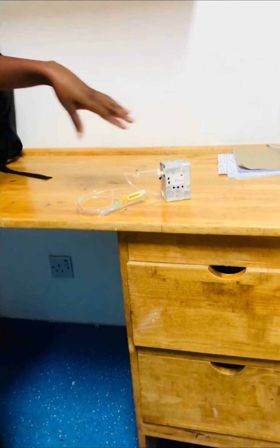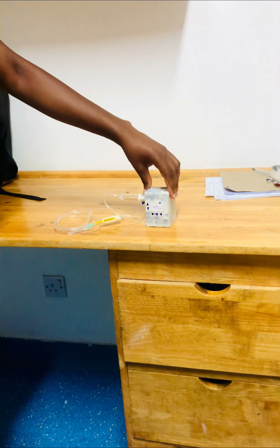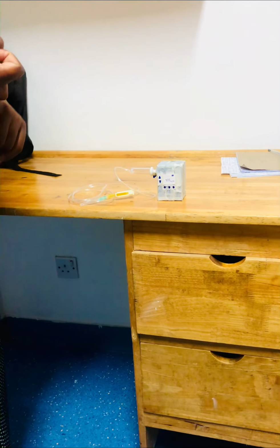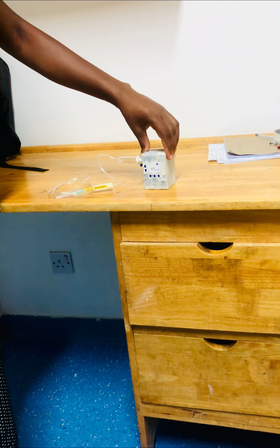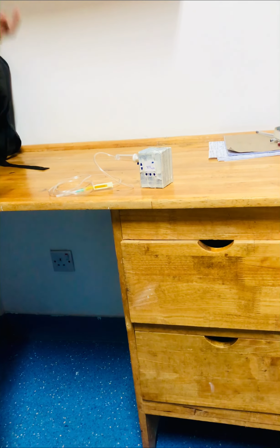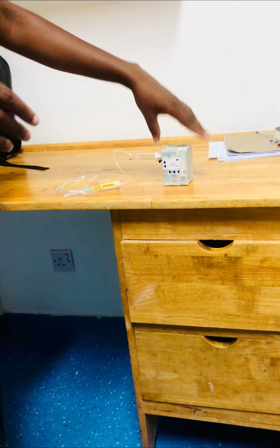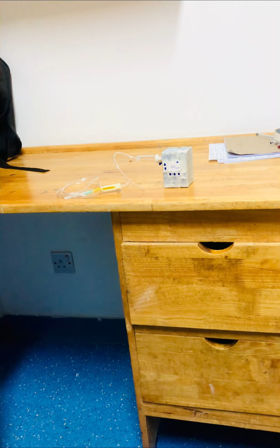When the user wants to use this automatic drug delivery system device, first, he has to have a glucose meter separately, and the user will only need the glucose meter because after opening this device, the user has to enter the amount of glucose that he has measured at that particular moment, and also the time duration that he wants the drug delivery system to provide insulin to the body.